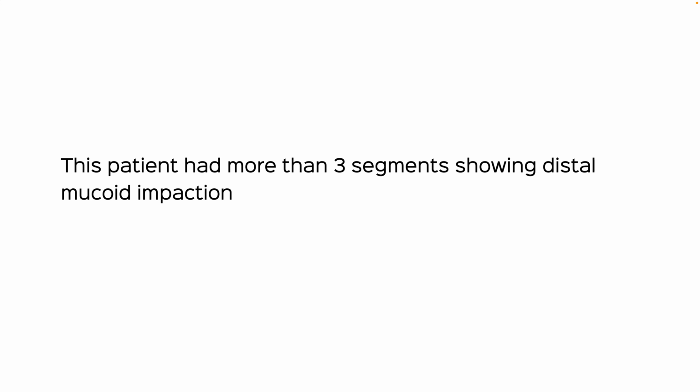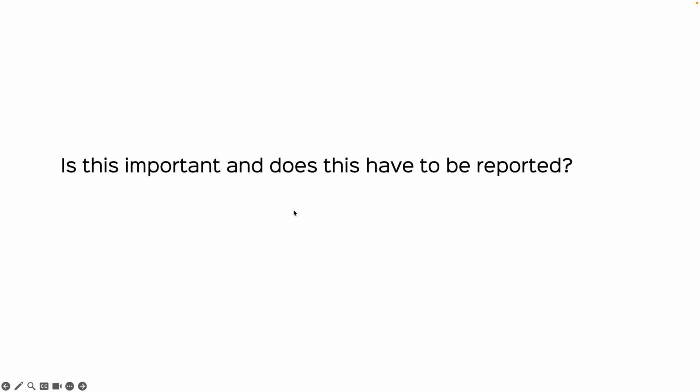And why am I mentioning this? I'll just come back to this. But more importantly, is it important to mention this? Should this be reported? Should we talk about mucoid impaction in the distal bronchioles?